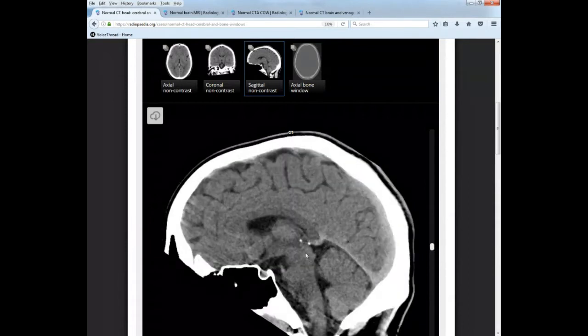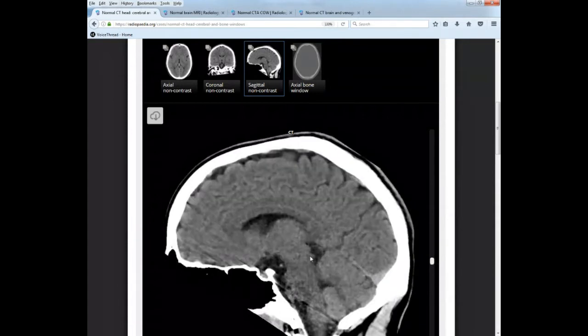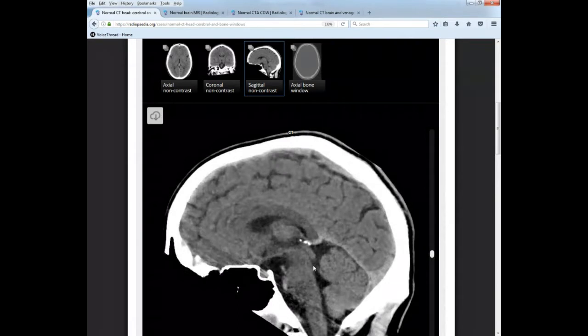And then after the 3rd ventricle, we have, again, not easily seen on the CAT scan, but it's right here, the cerebral aqueduct, or the aqueduct of Sylvius, down into the 4th ventricle, the triangular shaped one. So there's your 4th ventricle. That travels down through the central canal, and then you have the median aperture that goes down to the cisterna magna, which is back here.